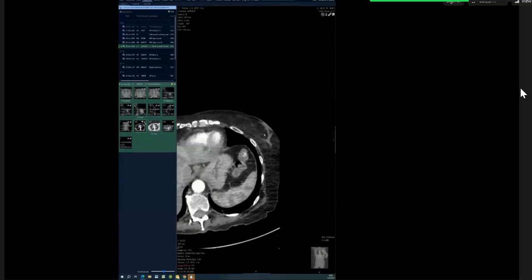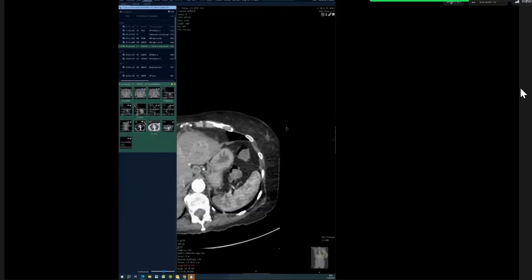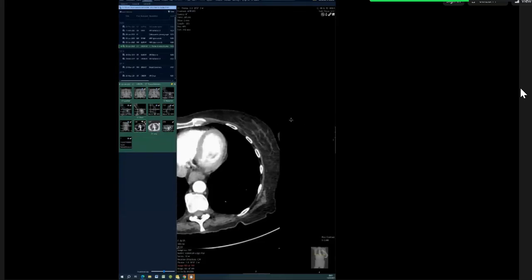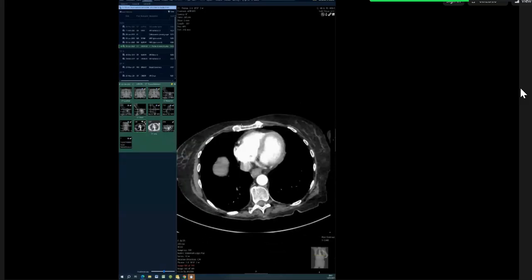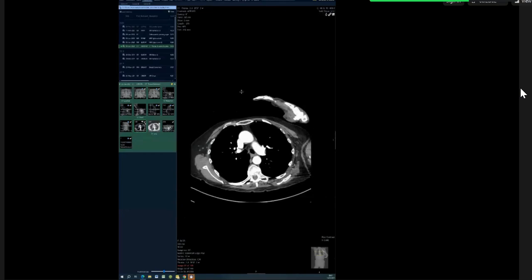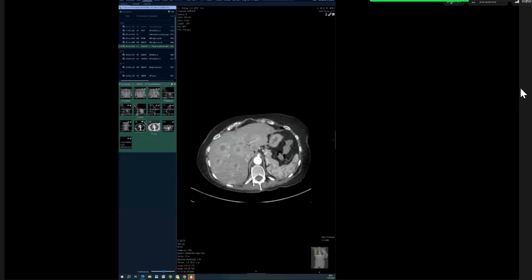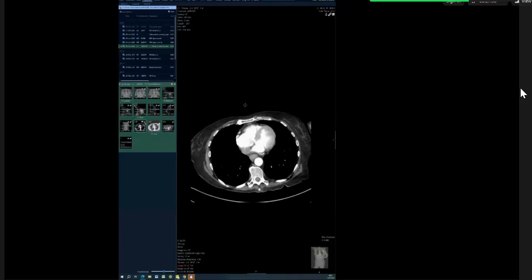Are you looking at this? I think that's nothing. It's just breast tissue. Okay, there's a right mastectomy. There's no mastectomy. I think it's just an old patient. They're a bit asymmetrical. The breast tissue is normal.